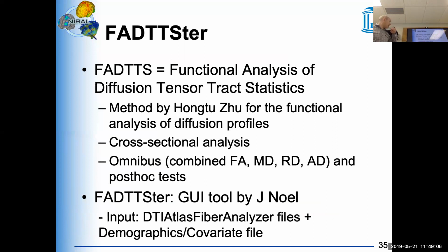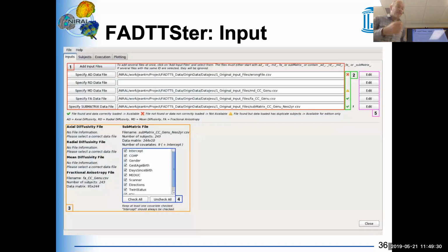And we had then a French student, Jean-Noël. He created a GUI around FADTTS. FADTTS is a MATLAB-based thing, and you can definitely create your own MATLAB scripts that call FADTTS, but it is actually quite complicated, and you can easily go wrong, which is why we wrote this FADTTster tool. FADTTster is actually quite nice.